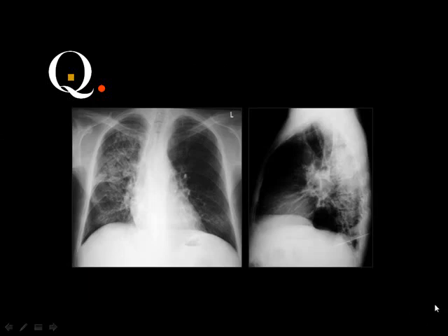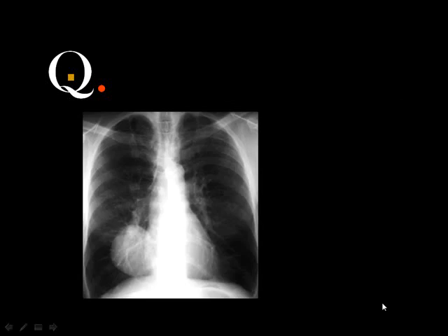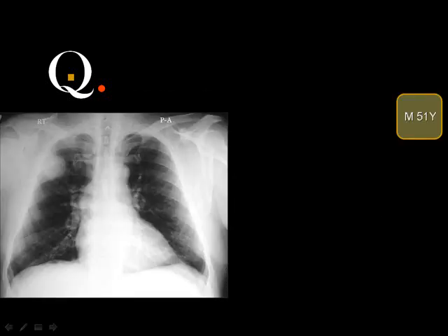Patch. Patch without history is pneumonia. Nodule, mass, patch, cavity. Cavity, lung abscess. Very good. Okay. Nodule, mass, patch, cavity. Mass. CT. Hydatid cyst. Nodule, mass, patch, cavity.